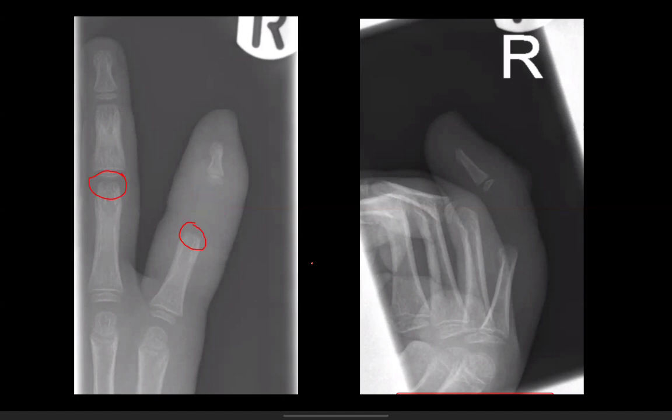Vanishing bone disease, yes, is the other option here, or Gorham-Stout disease. So this is incredibly rare, and it is when you get a lymphatic malformation within a bone that overtakes the bone and destroys it. So that would be a differential here, but you wouldn't expect such a dactylitis with that, I don't think. Such a red, hot, swollen finger with raised inflammatory markers.